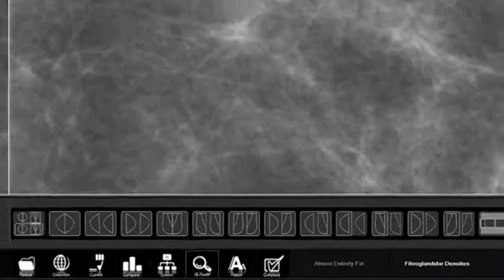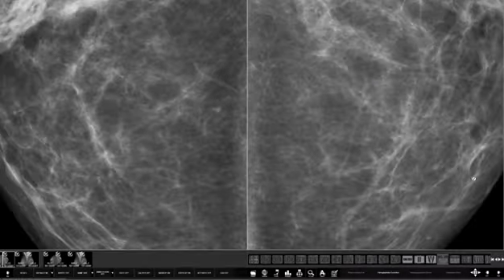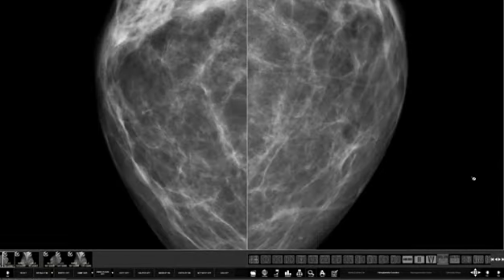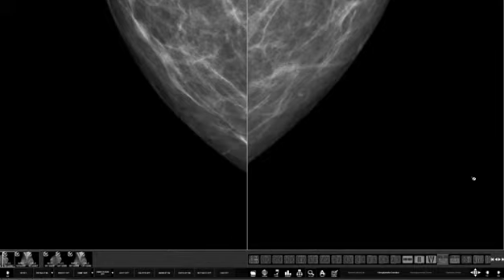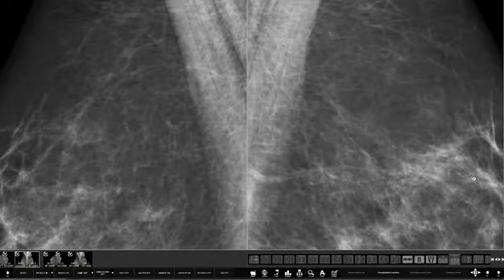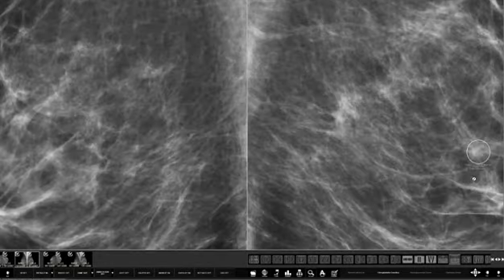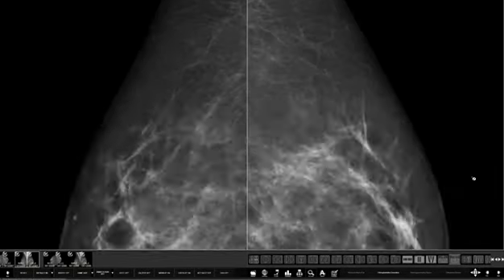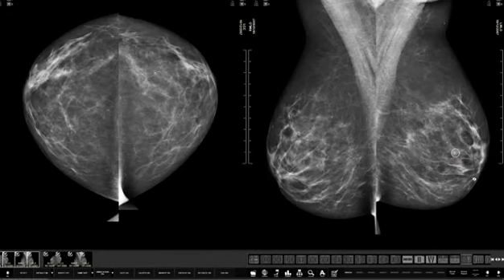The next step is All Pixels Display to help you view detailed information in images, such as microcalcifications or spicules associated with the mass density. The automatic tracking of the viewing path helps to ensure that there are no areas of the images that were missed in the viewing. Use the mouse wheel to scroll to each portion of the image in full resolution.